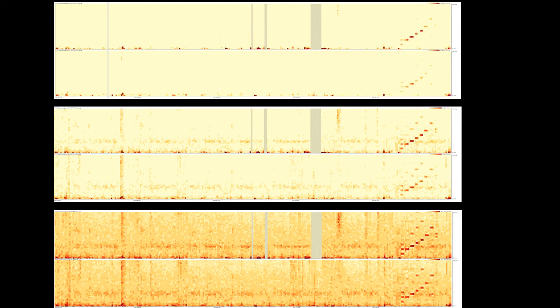Using the yellow, orange, red color scale, here are the 3 options for z-axis scaling shown side by side. The microvolts squared scale is shown on top, the microvolt scale next, and the square root microvolt scale on the bottom.